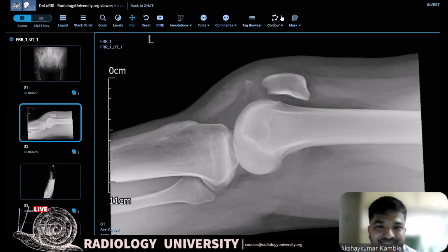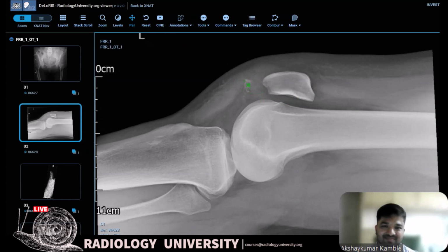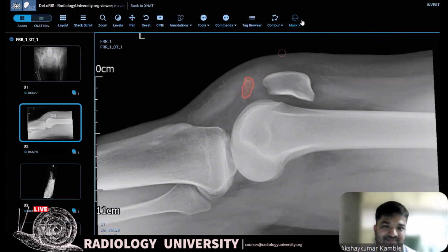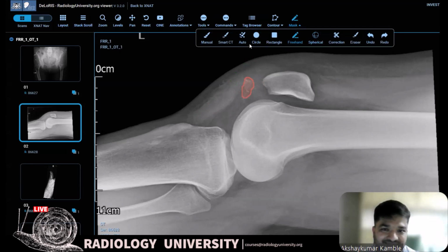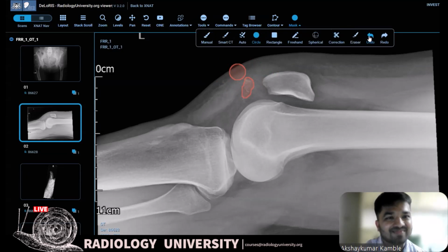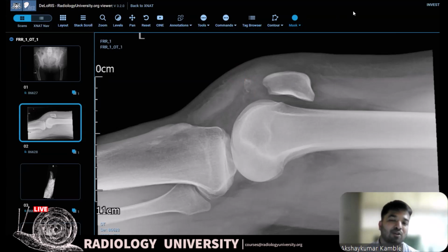So in this lateral knee radiograph, there is a bony fragment that is separated from the patella because we see a depression over the inferior part of the patella, and it's likely a patella tendon rupture with a fracture over the patella and pulling back this fragment inferiorly. Initially, I was thinking about something like a Sinding-Larsen-Johansson, but it should be overlapping with the insertion point of the tendon over the patella. Yeah, agreed. It should be the case.